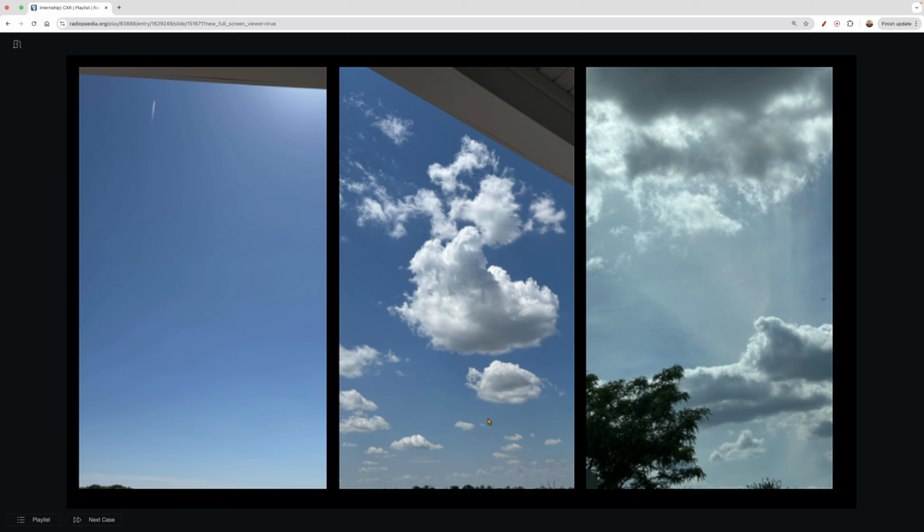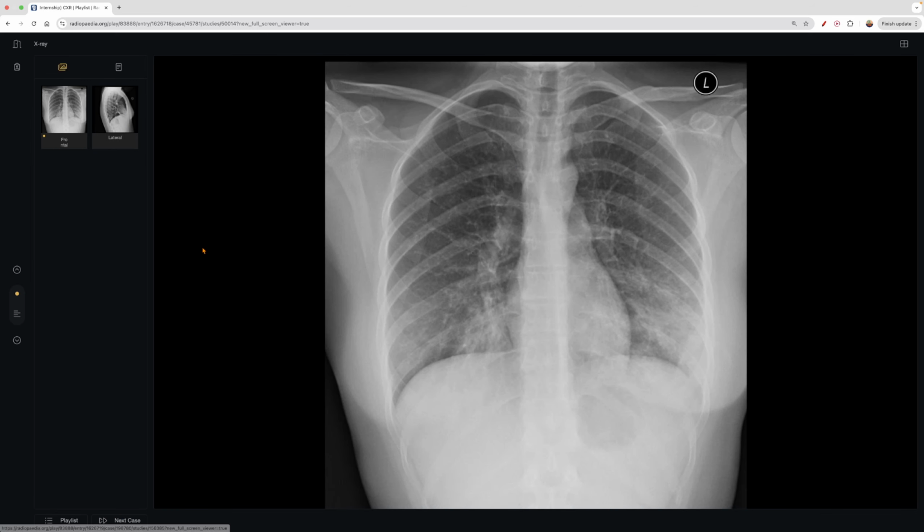And in radiology, we call this interstitial opacities. We'll discuss that in a little bit, but it has this hazy appearance, right? I wanted to include this in today's topics because of atypical pneumonia, typically bilateral, by the way. You can see there's something more here. There's some kind of hazy opacification, especially in this area, right? It's not so full-on fluffy cloud, but there's something definitely going on there. And if you know your normal anatomy, something's not right.